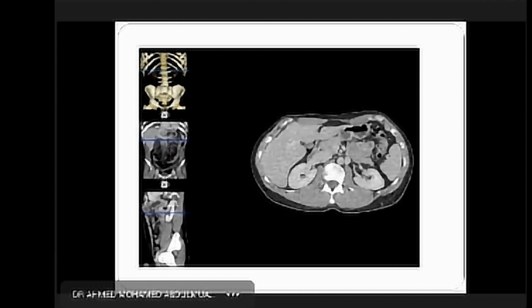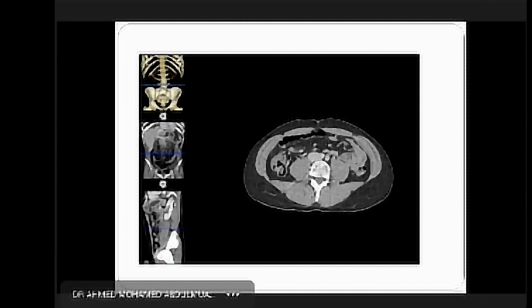We can see the right and left kidney, and the remaining part of the right lobe of the liver here, and we start seeing a little bit of the pancreas here, and you still see the spleen here and the transverse colon here. Then another little bit down, this is the psoas muscle, and this is the cecum here, and we have all the sections.